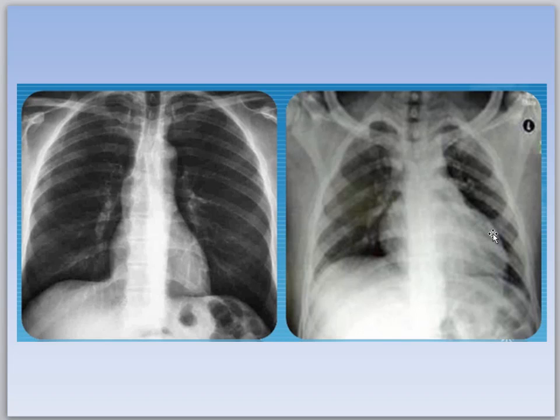This is not normal. This is marked left ventricular hypertrophy. So this can be caused from the left side of the heart is the power side, right? If the patient has, let's say, PAD, peripheral artery disease, where the arteries are really, really constricted, so it's really hard for the heart to pump blood, it has to work much harder.